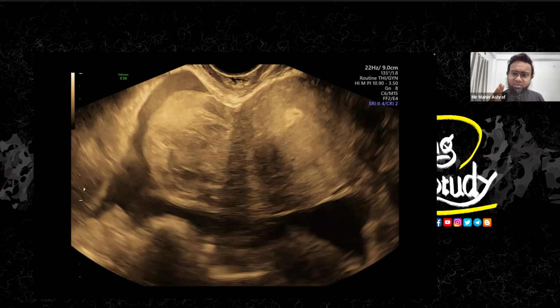If you have ever seen the liver with a linear transducer in a patient with coarse parenchyma, you won't ever be confused about the coarse nature. So just try to use the linear probe and you can solve that problem.